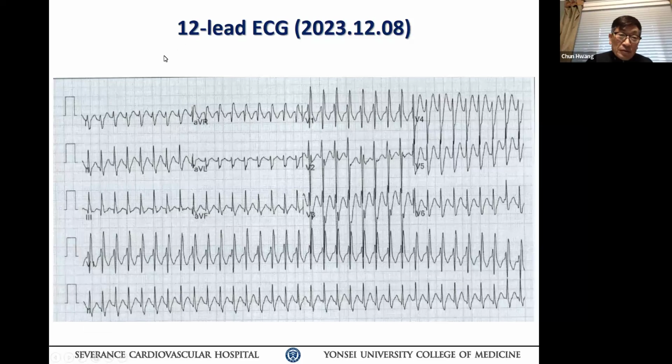So sometimes, as you said, in a posterior fascicular VT patient, even during the EP study, you can induce fascicular VT because many septal fascicles originate from the posterior fascicle, in more than 60% of cases. Therefore, depending on where you're pacing the fascicle from, you can create reentry. It's well known and well described by the Milwaukee group many years ago. Patrick Chu wrote many papers about it. And also, as a matter of fact, there's an interfascicular VT. They published many case series.